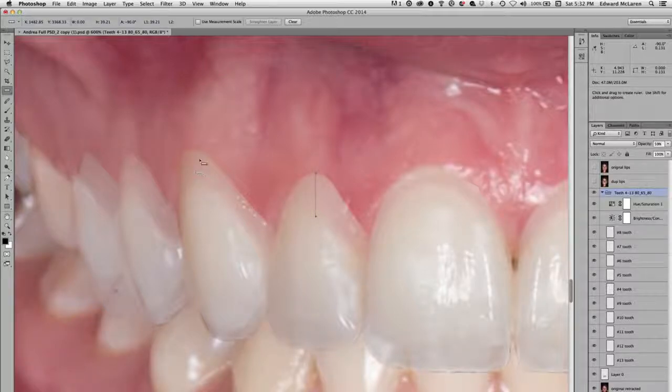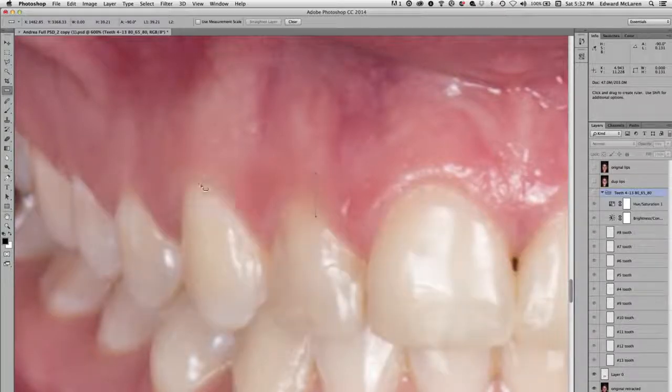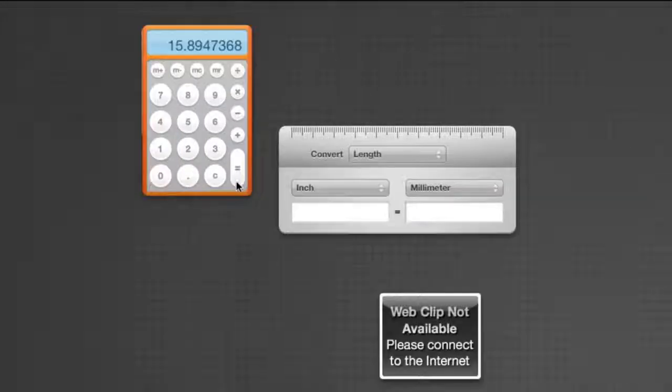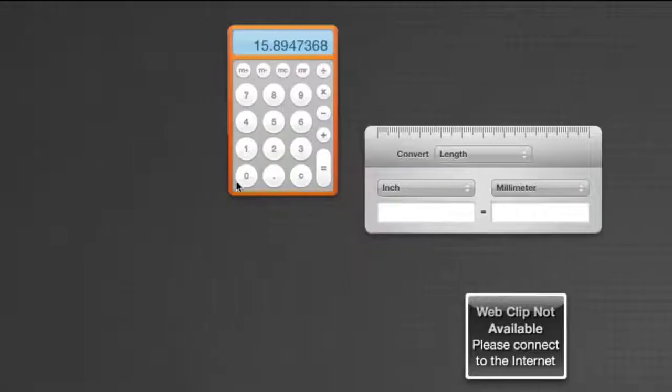All right, so let's now measure. Let's turn this off here, and just real quickly, let's measure the length of this. Hold down the shift key so we draw a vertical line. Okay, and then I can just visualize across there. That's the correct length. Let's come up here. We'll round up to 137 pixels, looking up here where I'm circling. All right, now I said the length was 9.2, not between 9.2 and 9.3.